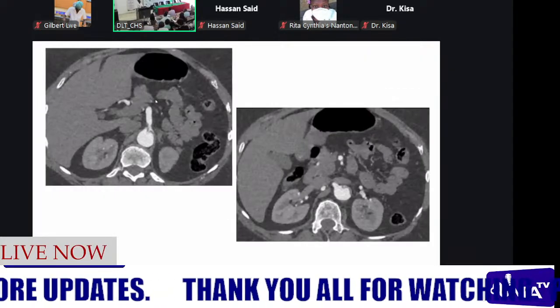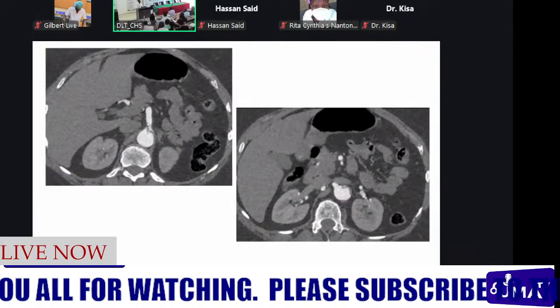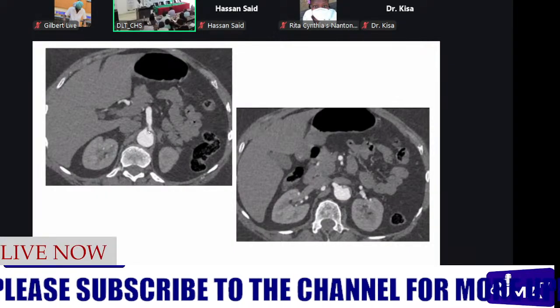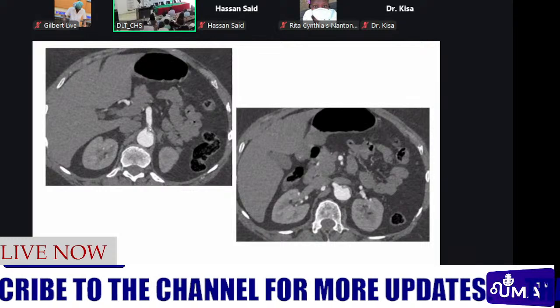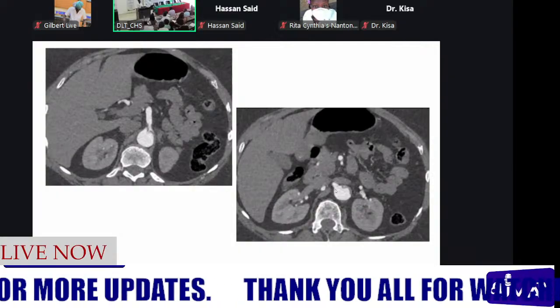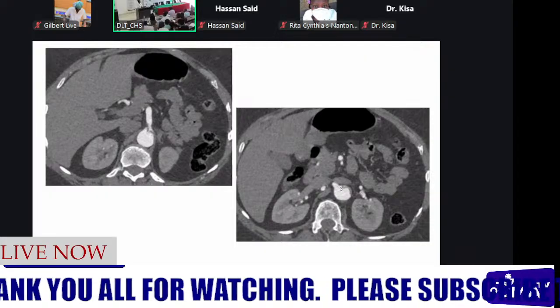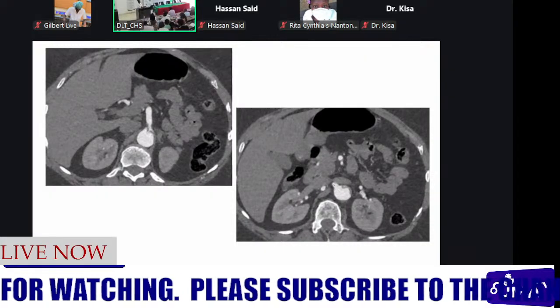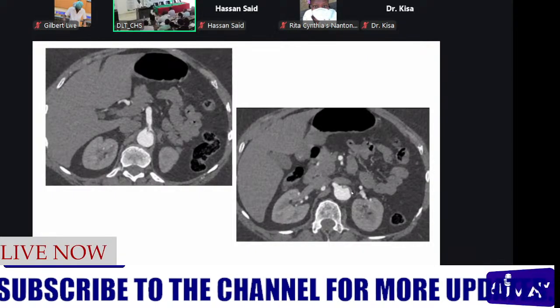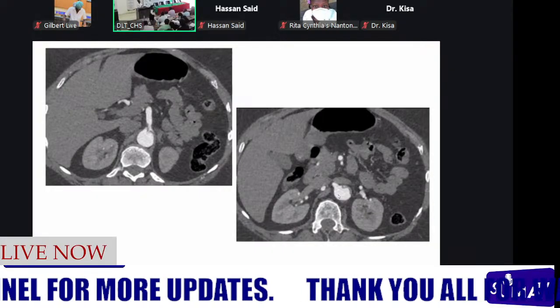Then we went down to the level of the superior mesenteric artery. At this point, it's the second branch of the abdominal aorta, and we see it's coming off. The dissection actually extends proximally into the superior mesenteric artery. However, it was largely receiving its blood supply from the true lumen. And then at this point, we are at the level of the origin of the right renal artery. And we see our right renal artery here, it's clearly coming off the true lumen. Still you can appreciate the false lumen, but it's really small now, but it's still present. So the dissection was still continuing inferiorly.